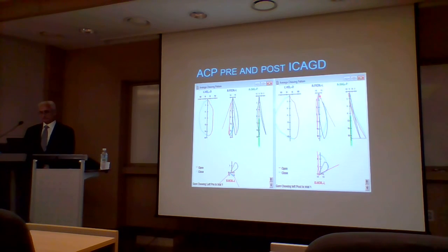프론탈로 봤을 때도 이제 치료하기 전보다는 패턴이 많이 이제 정상으로 생각하는 것에 가까워지는 것이고. Sagitally, this patient was chewing in front of their chin. Post-operatively, they're chewing under their chin. And in the horizontal, here they were chewing to the right and behind their head. After treatment, this is normal. You see they're following the normal. They're chewing out and to the left. 그러니까 보면은 그 전에는 뭔가 뭐를 피해가지고 츄잉 패턴이 나타났던 것 같은데 치료하고 일주일쯤 지나고 나니까 패턴들이 보통 생각하는 쪽으로 정상적으로 돌아온 걸 보여주고 있어요.